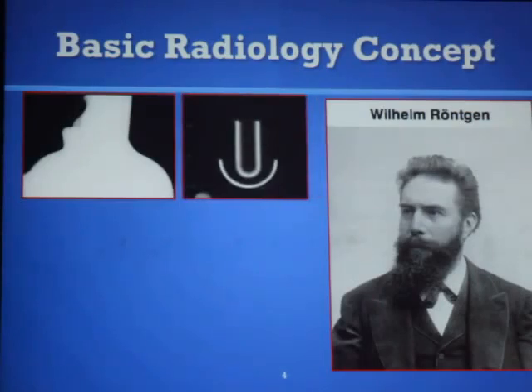Now we see another object being radiographed, and now you can make some more difference because now we have two colors, a white and a black, giving it some shape to the object. So we can see a little bit more on that screen.